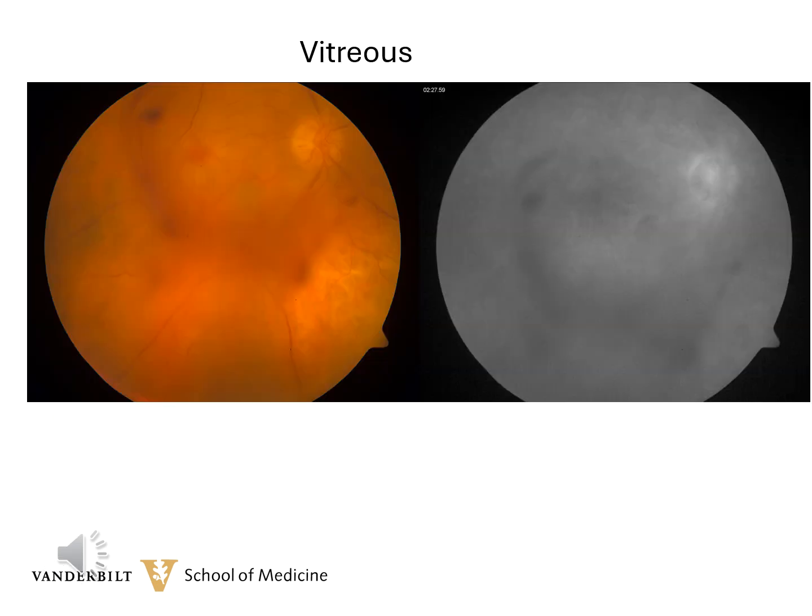We'll start here with a very anterior hemorrhage. This is a vitreous hemorrhage. This patient has diabetes and bled into the vitreous cavity. You can see the reddish appearance on the color photograph. It is covering the major retinal vessels and partially the optic nerve. You notice it's in the vitreous and not pre-retinal because there are no sharp edges to the hemorrhage. The hemorrhage blocks view of any normal or abnormal fluorescein in the retina.